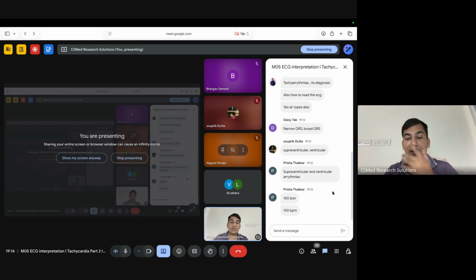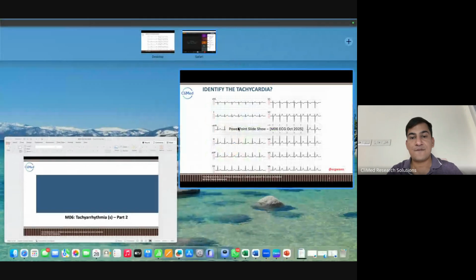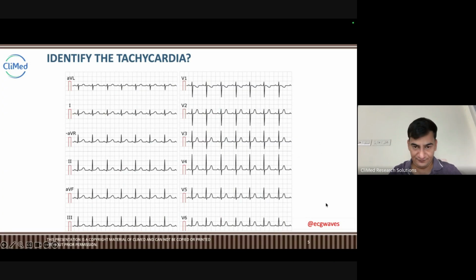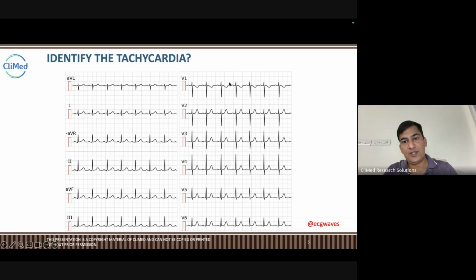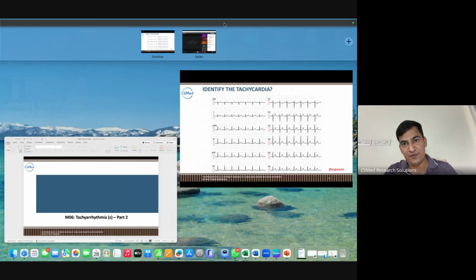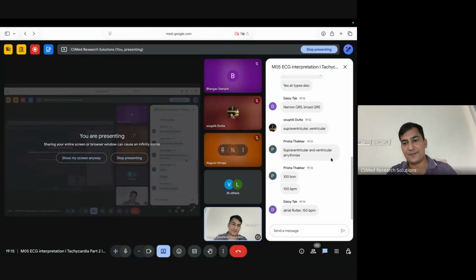Okay, only one person has calculated. Guys, everyone, what are you doing? Calculate. You want to see that again? See here. Calculate the heart rate and tell me which tachycardia this is.